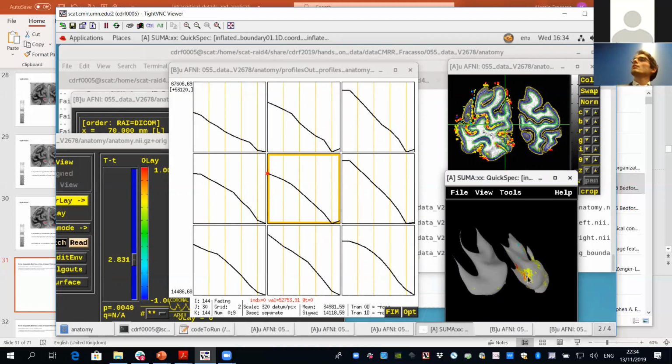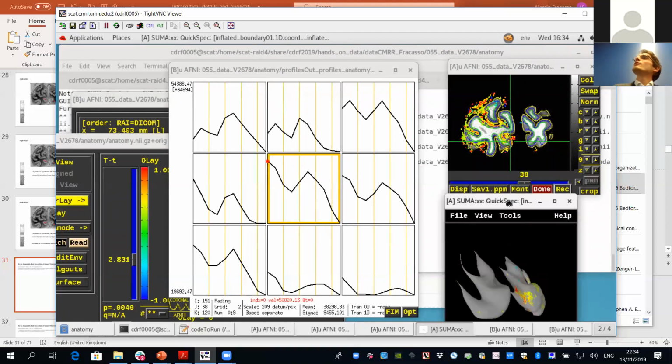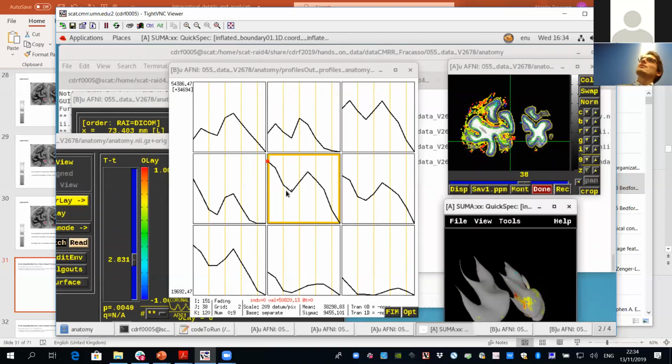And so we can see, if you go in locations that are in the middle of the cortical depth, there. Okay, this was lucky, fair enough. I didn't plan it. I kind of planned it, but not so nicely. Anyway, this is beautiful. So you see that in the middle of the cortical depth, there is this nice discontinuity.